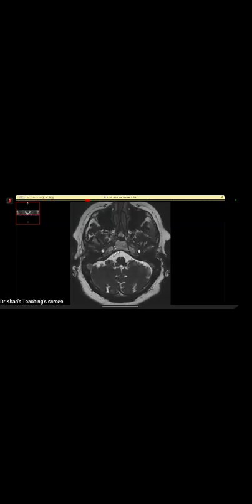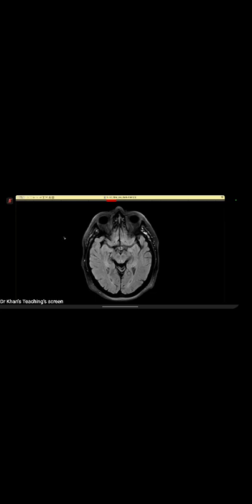The ENT asked for the patient has got tinnitus left, classical. So they did an IAM scan, and the IAM was normal. There were some sequences which in our protocol we do in addition. It's not a classical brain, so I'll show you one of them, which is this one. Over to you.